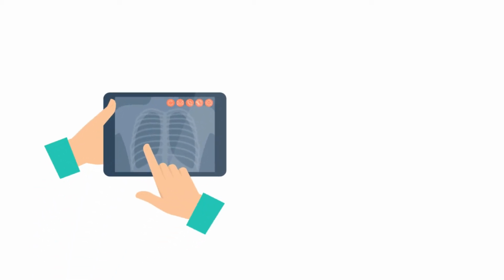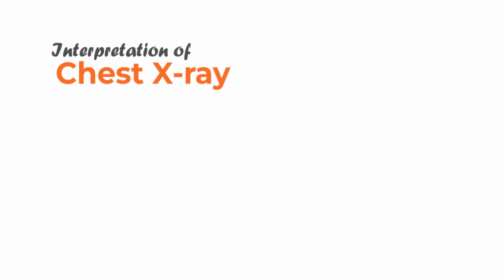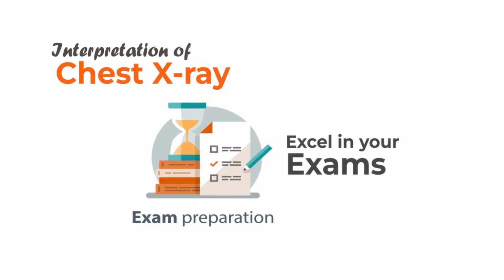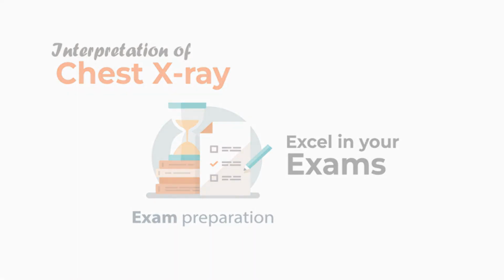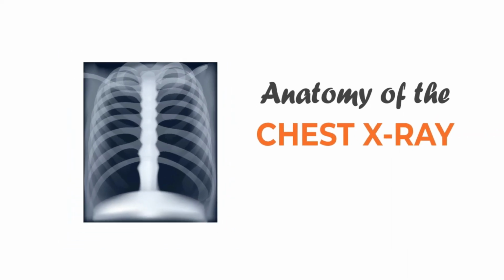Today we're going to have a look at how to interpret chest x-rays. Interpreting x-rays is a fundamental aspect of being a junior doctor, and it's something you should learn as a medical student. It will not only help you become that amazing junior doctor, but also you'll be able to excel in your exams. The best way to learn how to interpret x-rays is by starting off with the anatomy, and today we're going to focus on the anatomy of a chest x-ray.